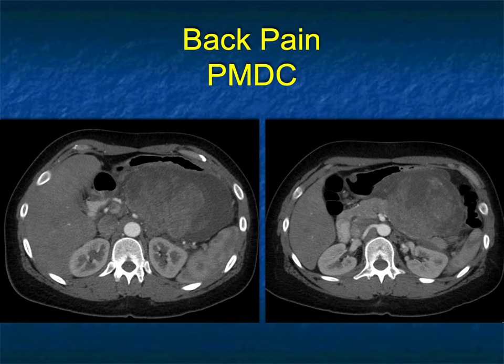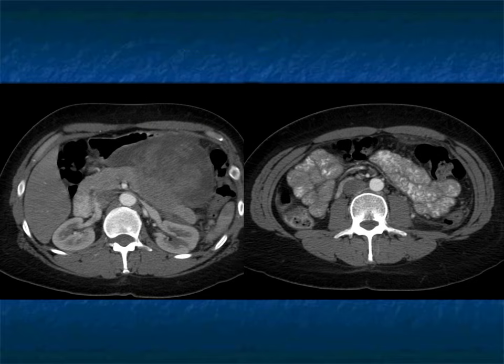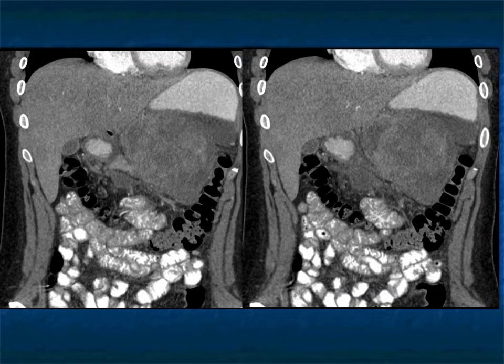And you can see on the image on your right, it looks like maybe it comes from the pancreas. So you can say, could this be a big cystic pancreatic tumor like an MCN with malignant transformation? You scan further down, there's no adenopathy. The small bowel looks good. You can see how large the mass is, intimate relationship to stomach, to the left kidney, but again to pancreas.